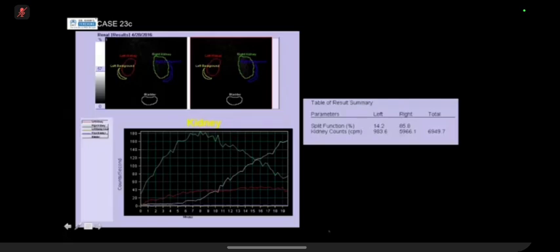So the left kidney has persistent mild retention and uptake without any visible excretion. The right renal excretion shows gradual uptake and a favorable downslope excretion. And the split function demonstrates that it's mainly the right kidney that is showing renal function, 85%, and 14% on the left side.